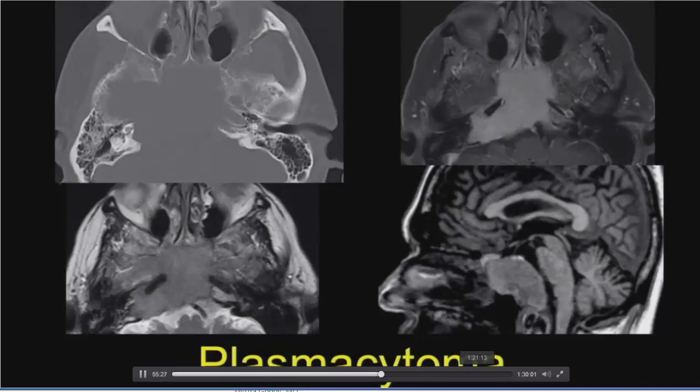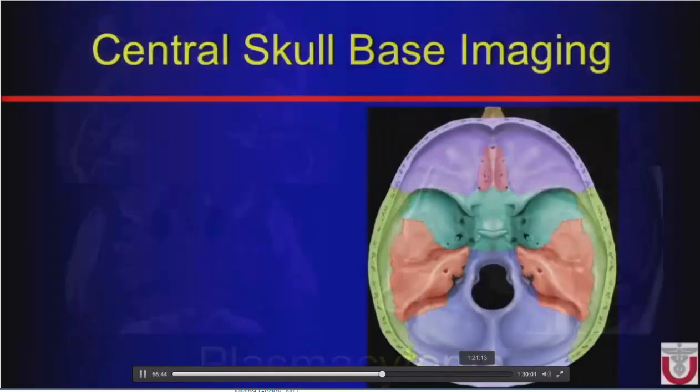And I was cool about it. I said, oh, well, really? Well, you know, I guess every now and then you get something, right? But this is an area where if you think about the imaging characteristics, think about the pathology that's there, think about the normal anatomy, we can sometimes come up with the right diagnosis based solely on the imaging.